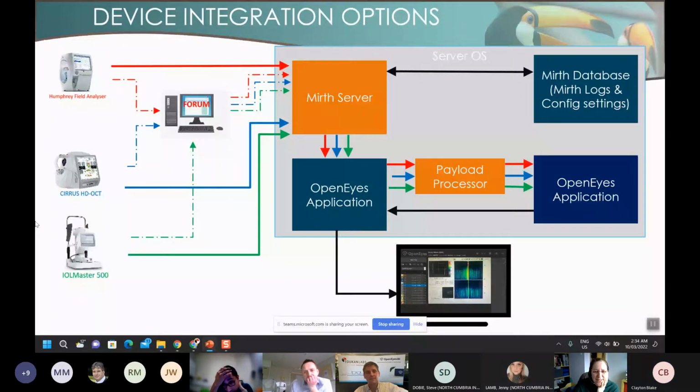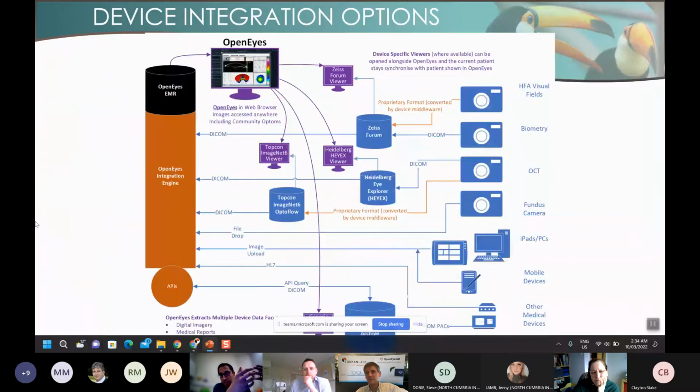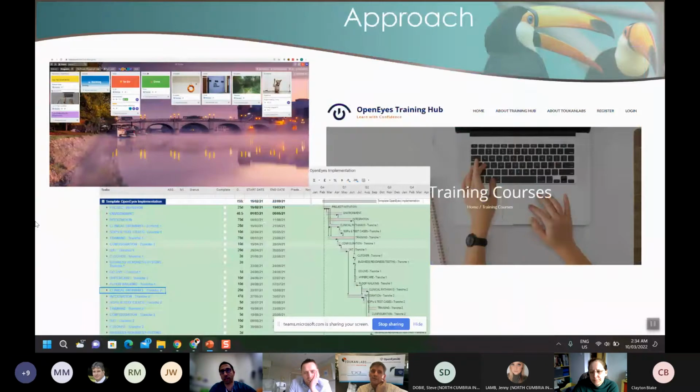I think Ian's going to jump in. Because we're a tertiary centre, we often send patients back to their local units. When you create a letter, you can attach any of those other events as additional pages, like enclosures to your letter. You could add op notes or copies of visual fields, and they will just add to the printout or PDF of that patient. So you could export every single bit of data from that patient in a print format that is nice and easy to read, or extract it in a more data format. But I assume what you're after is a print format, for medico-legal purposes or for patients and records. And you can do that fairly easily.